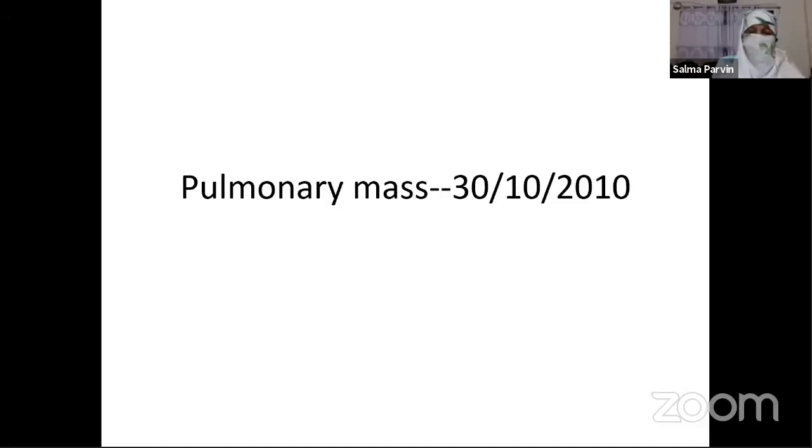Bismillahirrahmanirrahim. Our today's topic is a continuation of pulmonary lesion as a pulmonary mass.